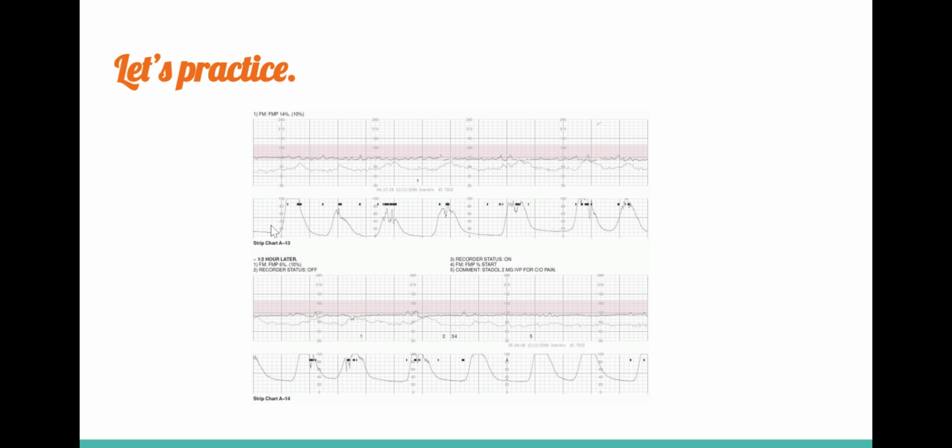Okay, so let's start with uterine activity. How far apart are these contractions? We start here, go to the beginning of the next one. It's about 1 3/4 or 1 2/3. A little close. And 1.5. Oh, this isn't a pattern I necessarily like. I like 2 to 3 minutes. So we've got 1.5 to 2 minutes apart.